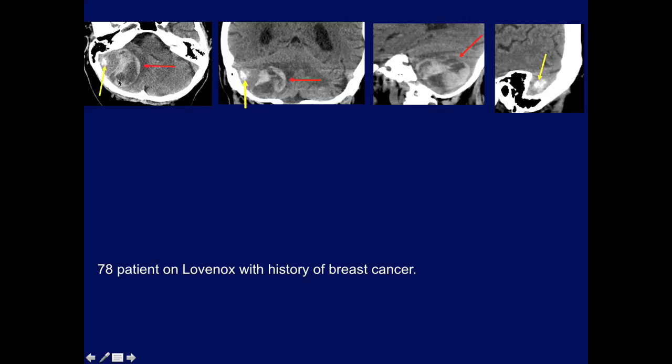So the question was, is this a metastatic lesion? Was it just a bleed because the patient was anticoagulated, or was it a bleeding meningioma? Remember, bleeding meningiomas, which I've said before, are extremely rare, and it's hard to find a bona fide case where nothing happened or the patient was not on anticoagulant, to show really that the meningioma bled.